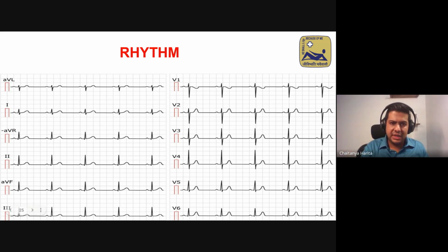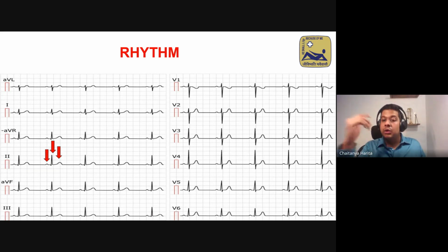So if you look at this ECG that I've shown you, you will see there is P, which is an indication that the SA node stimulated the atria. QRS, AV node sent to bundle of His and stimulated the ventricle, and T waves, ventricular repolarization. This order means the patient is in sinus rhythm. Anything else, mention the rhythm is abnormal. Say you're seeing QRST, no P, abnormal rhythm. You're seeing QRST, P is after T, abnormal rhythm. So very simply, P QRST in all complexes, of course, you look at lead 2. Then you can comment sinus rhythm.